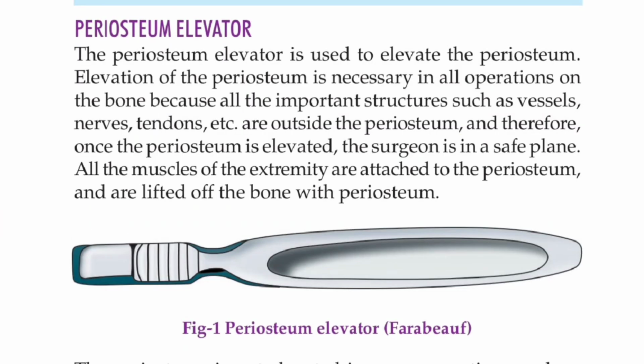So here you can see this is a periosteum elevator. Okay, so this is used to elevate the periosteum. It is necessary in all the operations because once the periosteum is elevated, the field is free from all the vessels and the nerves, tendons and muscles. Okay, so this is periosteum elevator.